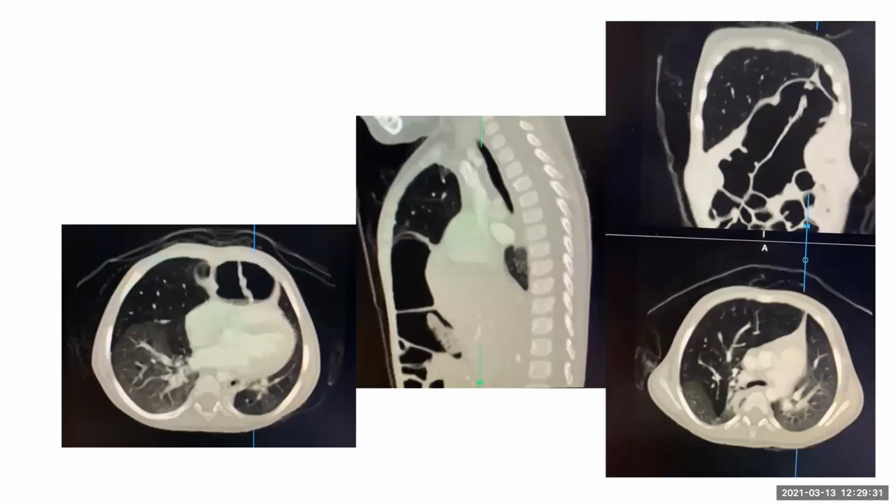You asked for a CT scan, so here's the CT scan as well. This confirms our findings of a diaphragmatic hernia. I can see the bowel loops extending into the thorax. Anything else you can see in the lungs in this CT scan?